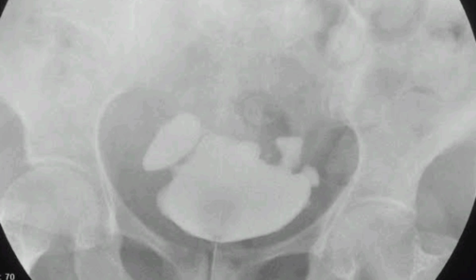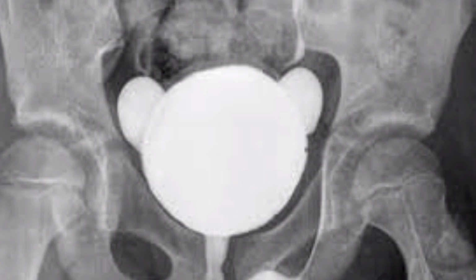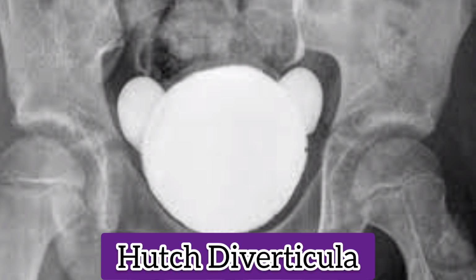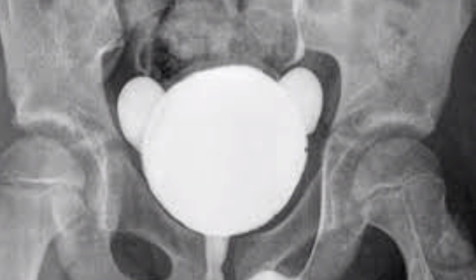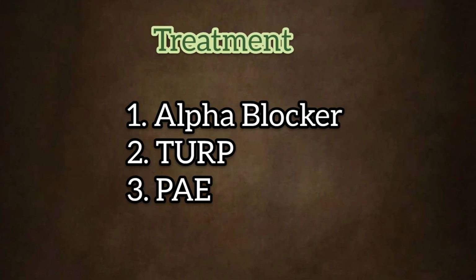Like in this patient, there are multiple diverticula which are filled with the contrast, and these are the outpouchings of the urinary bladder wall filled with the contrast. This is another example of the urinary bladder wall diverticula. These are called the Hutch diverticula. These appear as Mickey Mouse, and these are usually present at the VUJ junctions, and these are due to the weakness of the bladder wall. These are congenitally present.